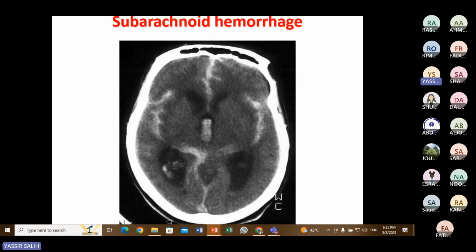Subarachnoid hemorrhage. Why subarachnoid hemorrhage? Why couldn't it be subdural or epidural or intracerebral?